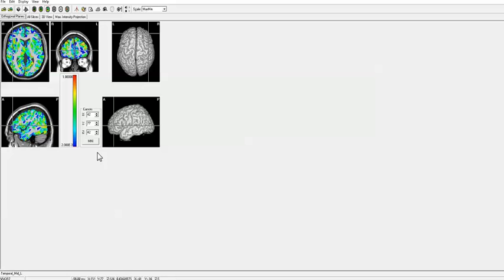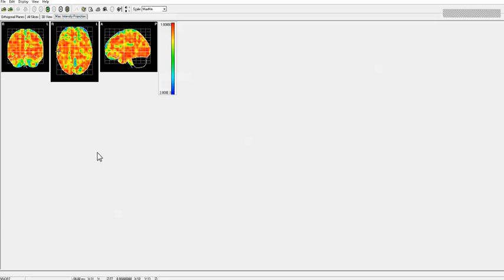For example, we can change transparency of the view. What we're doing here is changing the transparency so that you can look at different Brodmann areas in different ways. Now we will simplify a lot of these options so you don't have too many of them. They can be rather overwhelming, but the idea here is to show you a new view.